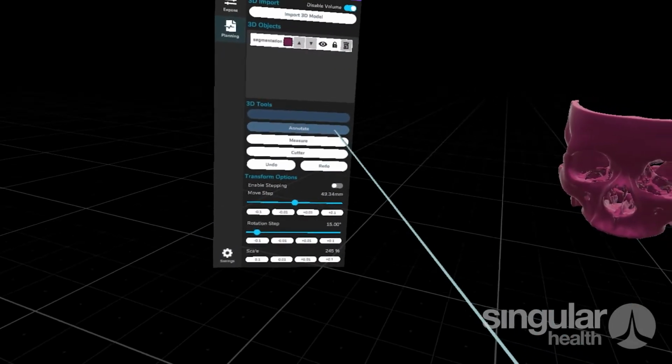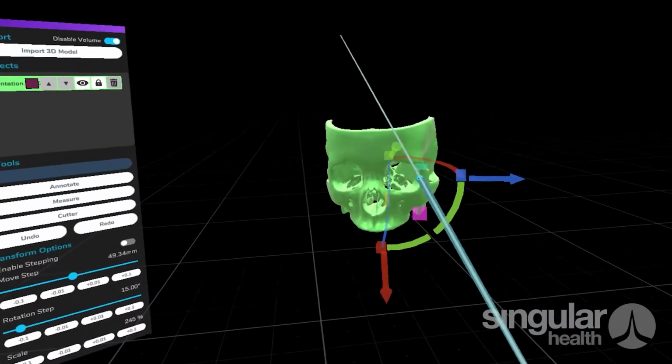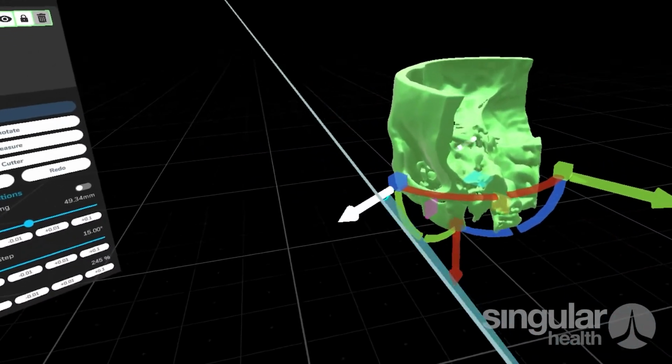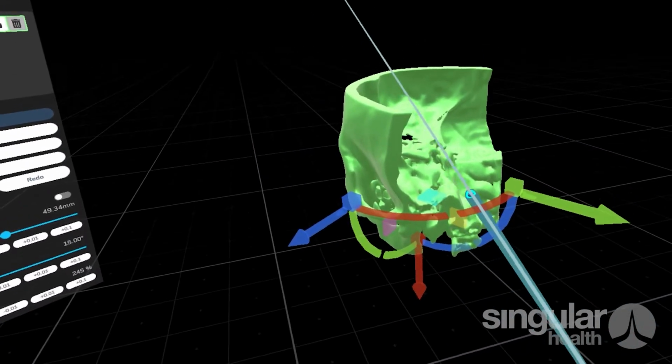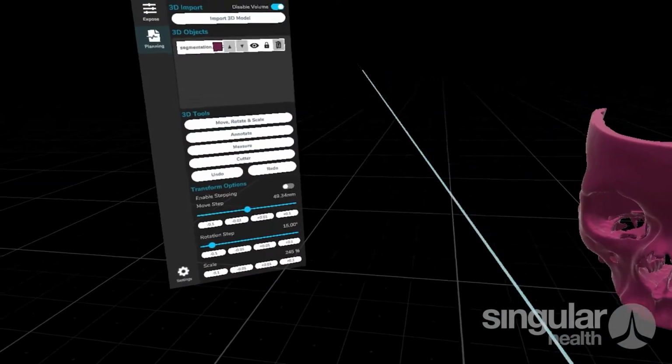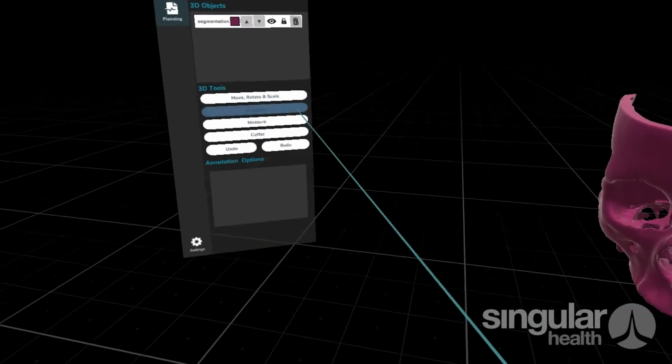So further on, now move on to the annotation side of things. In fact, I'll just grab the model and bring it a bit closer to us, like so. Cool. All right. And we'll do it here. There we go. So next up we have the annotate model.